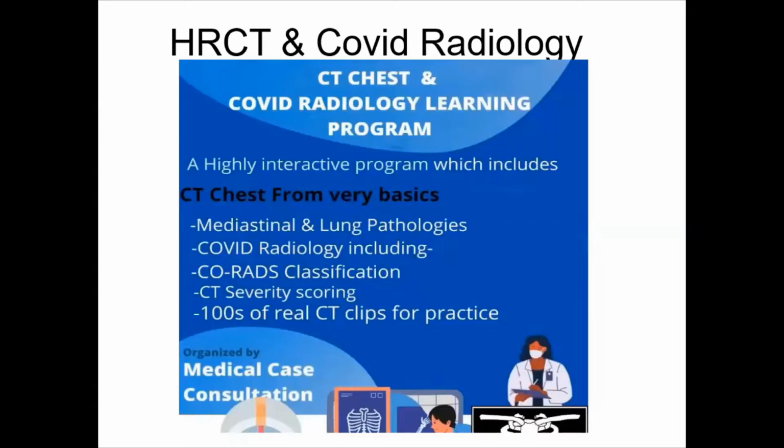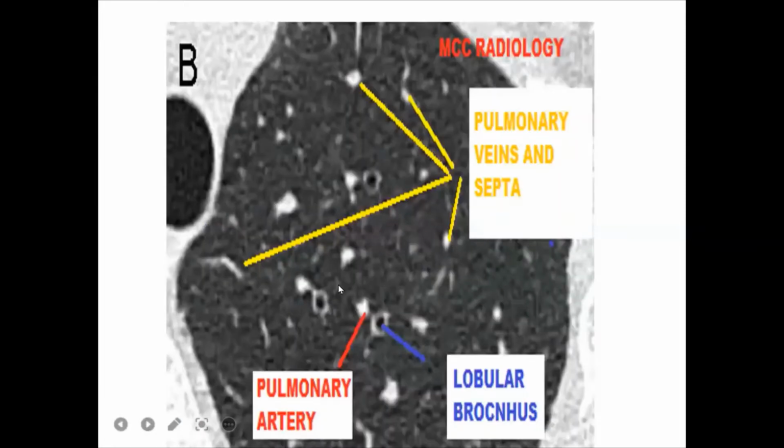Remember, today we will discuss various patterns of HRCT and COVID radiology. So let us start. This is how the various structures look in a CT, HRCT. So let us try to identify.